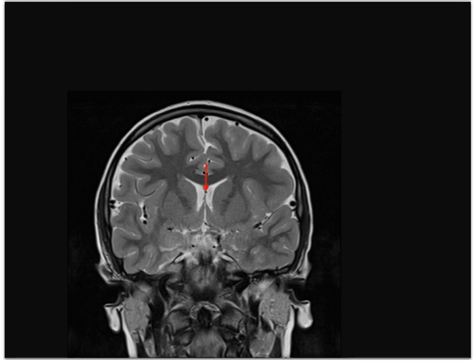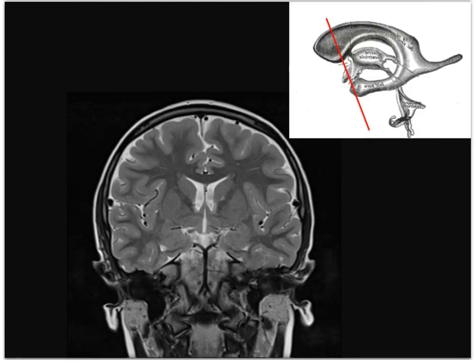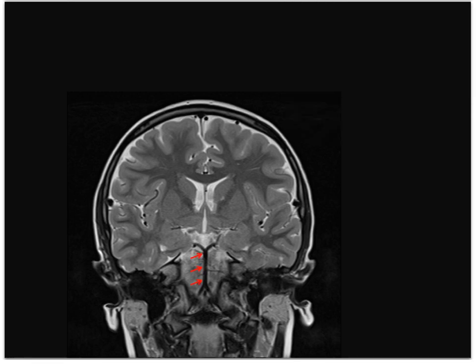At this level, septum pellucidum separates frontal horns of lateral ventricles, and small veins are seen along the septum. Head of caudate nucleus is here, and here is the putamen. These deep nuclear structures are separated by the internal capsule fibers, and that's a relationship we need to remember. The basilar artery lies ventral to the brainstem in the midline.